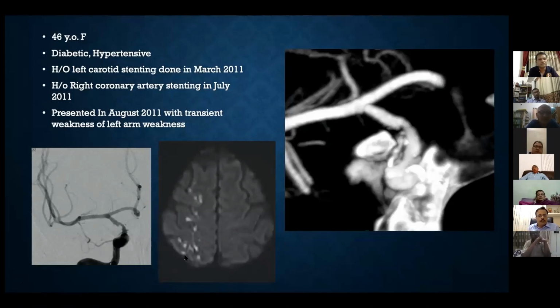And we also study vaso-CT and the plaque architecture of intracranial stenosis, like this patient, severe intracranial stenosis, recurrent embolic infarction. So this is again the vaso-CT 3D images. You can see this is the plaque. You can see heterogeneous plaque with a lot of calcification and hypodense area. And no wonder this was a complicated plaque which was causing recurrent embolism in these patients.